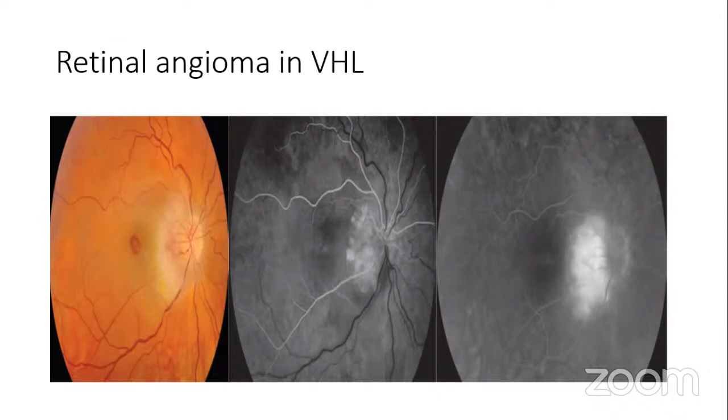So at this phase, someone already just said which phase we are in now. If you look here, you can know the phase we are in. What you have here is the arterial filling. The veins are yet to fill. You have the background hyperfluorescence from the choroid. So this is the arterial phase. The veins are still empty, but look here. You see patchy hyperfluorescence within the tumor.